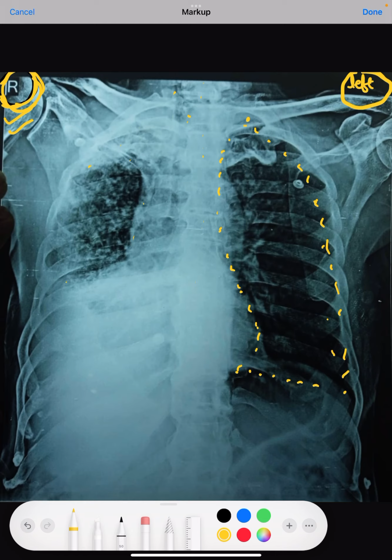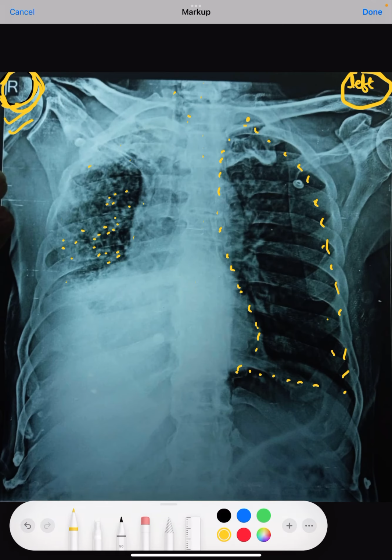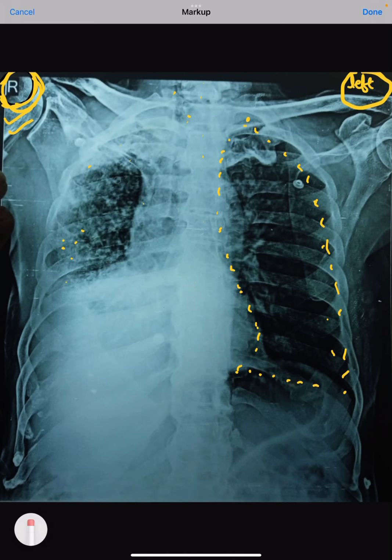We can very clearly see the dotted infiltration. These are more of a significant lung damage that has occurred over a period of multiple years. So this is more of an irreversibly damaged, fibrosed lung, and in between you can see calcification in these lesions.